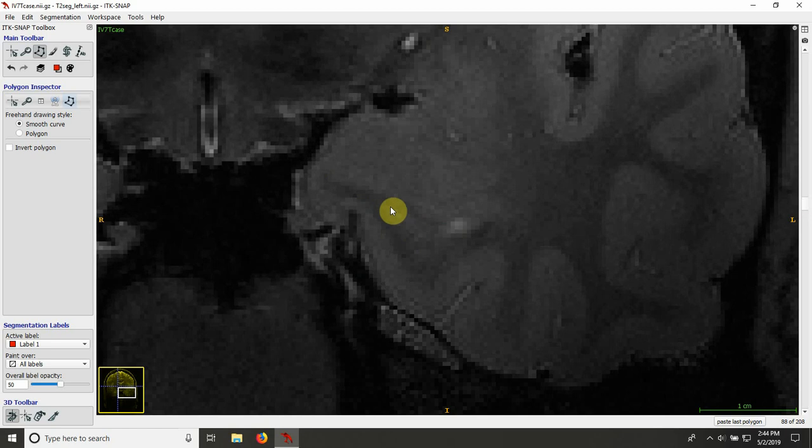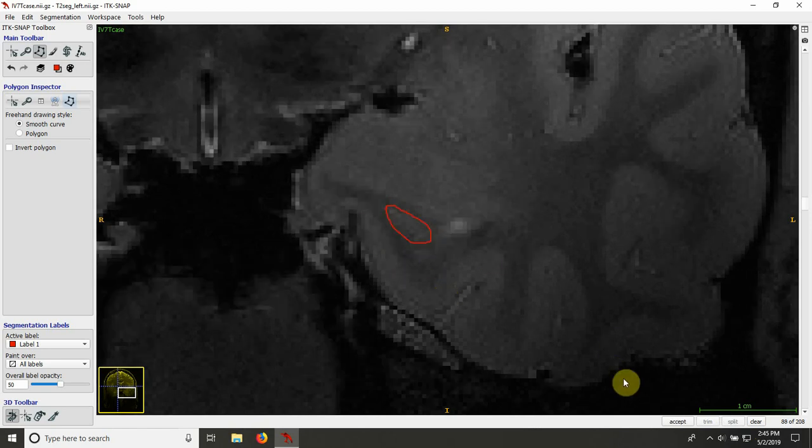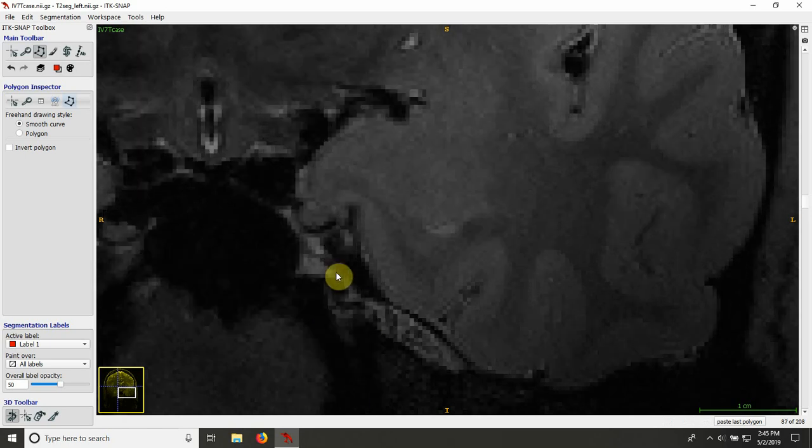And then here, I think this might still be some hippocampal voxels. So actually, if you paste the outline on the previous slide, you can see that these voxels are probably right in the middle of that outline. So I'm gonna outline them here, and then just to check, I'm gonna go again back to that posterior slice. What you can see here is that it falls right in the middle. So I think this is probably going to be hippocampus. So this is how I would outline it. And then one slice further anterior, I don't see it anymore.